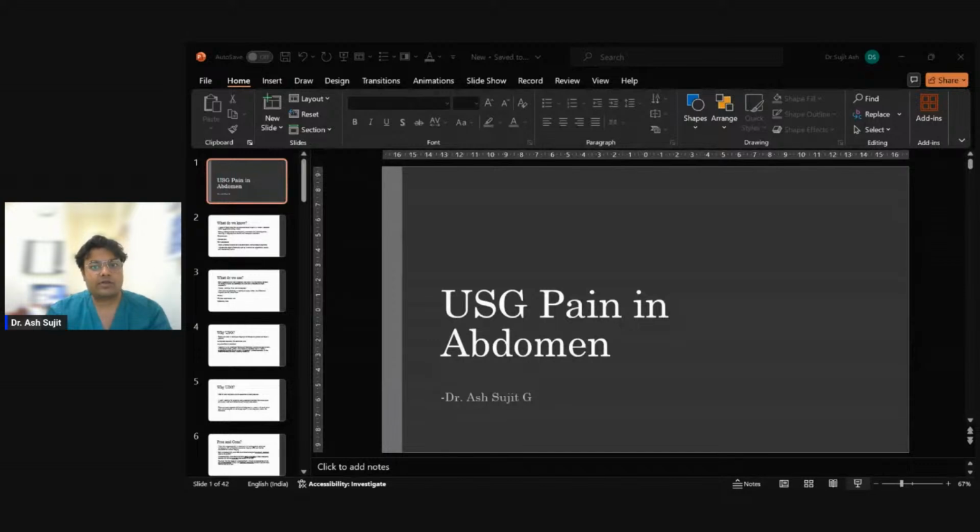Clot retraction will produce a thicker appearance, peripheral septations, or a mural nodule, which can appear vaguely triangular. The blood products can also layer into fluid-fluid or fluid-debris levels. Looking at the first picture, for understanding, it shows the fine septations, which are pseudotrabeculations. In picture B and picture C, there is a triangular subsiding area. That is the clot retraction, seen once the clot starts resolving. So this is mainly follicular cyst, corpus luteal cyst and hemorrhagic cyst leading to pain in the abdomen. When a hemorrhagic cyst ruptures, complex or echogenic fluid can be visible in the pelvis. Occasionally, a ruptured hemorrhagic cyst can result in hemoperitoneum, with blood tracking into the upper quadrants of the abdomen also.